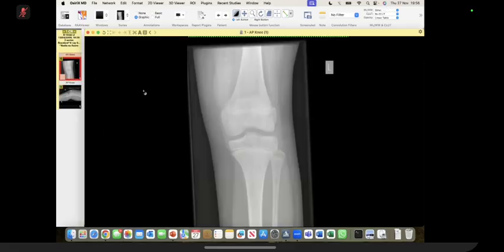Again, I can see that the lesion in the fibula appears to be lucent, with a wide zone of transition, and there is no cortical discontinuity or periosteal reaction seen. Considering the wide zone of transition, I think this is an aggressive looking lesion.